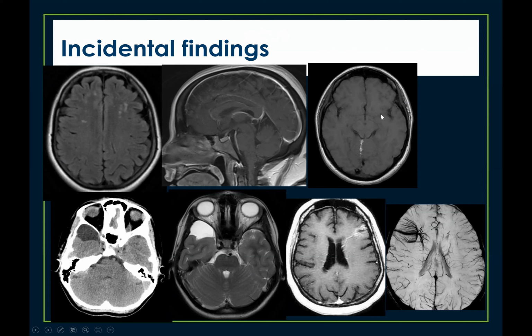Young female patient with migraines, incidental finding of cerebellar lipoma, likely of no clinical significance. This happens during development, so likely brain plasticity took care of this. There's no reason to follow up, just reassure the patient.